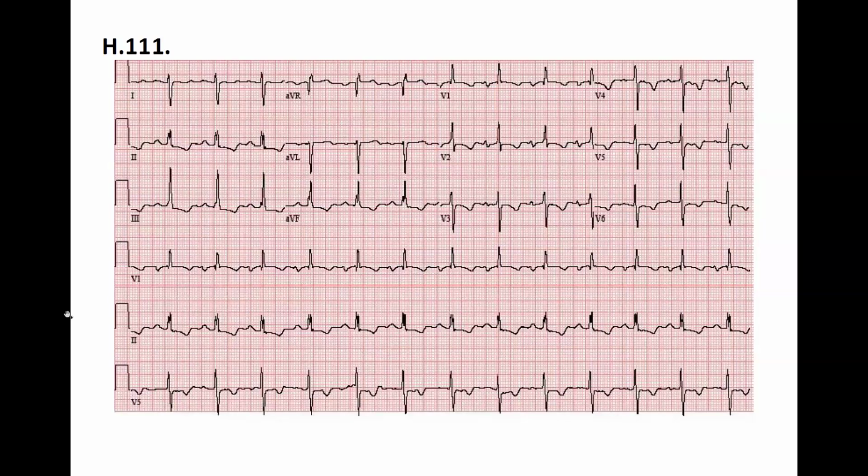Okay. And we go back to the first one. Hello. Oh, hi. Okay. So starting off again, it's a rhythmic ECG.